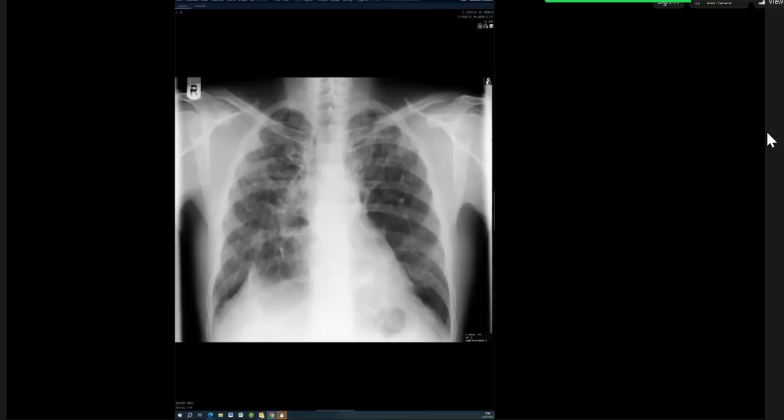This is a frontal radiograph of the chest of a mature skeleton. At first instance, I see there's no pneumothorax, pneumomediastinum, or pneumoperitoneum. I see that there are bilateral opacities in the upper zone and mid zone. They appear to coalesce, and they appear to be more in the periphery. So this pattern is seen in progressive massive fibrosis, as seen in coal workers' pneumoconiosis. So I will inquire with the patient about any occupational history and review any previous radiographs if available.